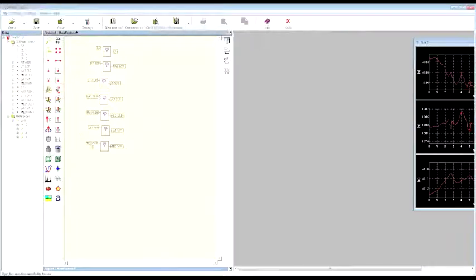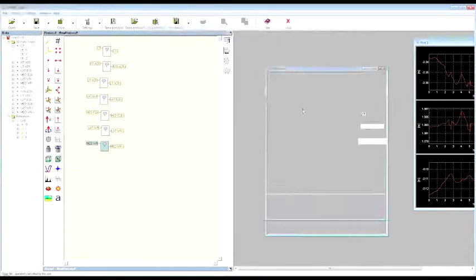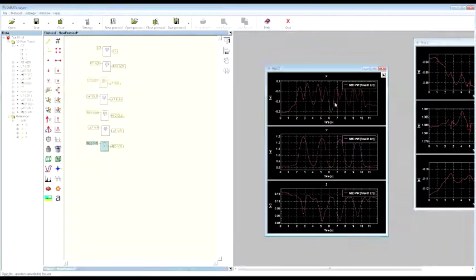So now I want to show you the results. Before, as I have already shown you, we had a gap within this trajectory, and after you perform the interpolation, you can see that now you have a complete trajectory over the complete acquisition.